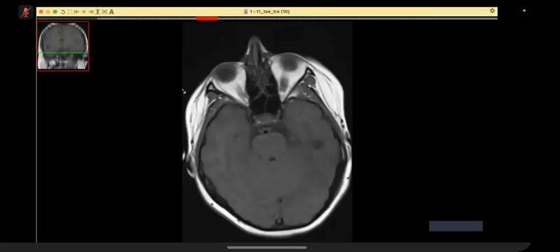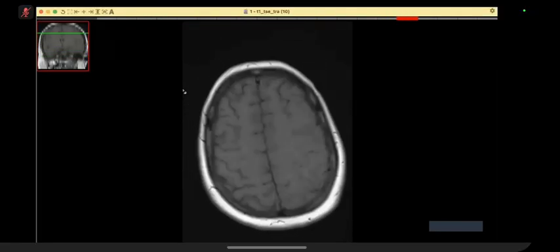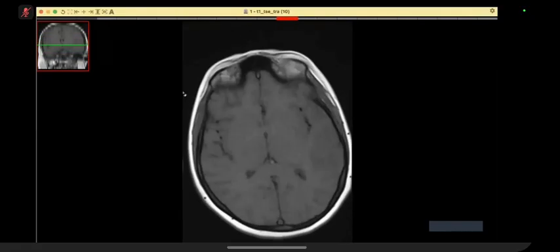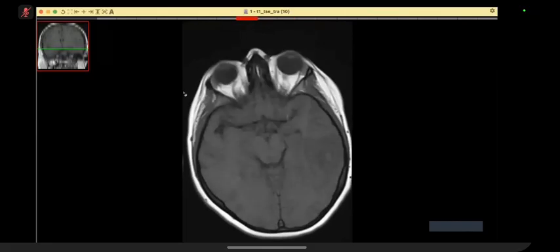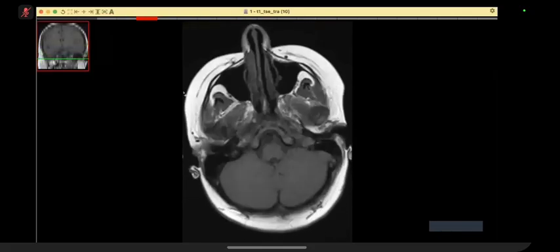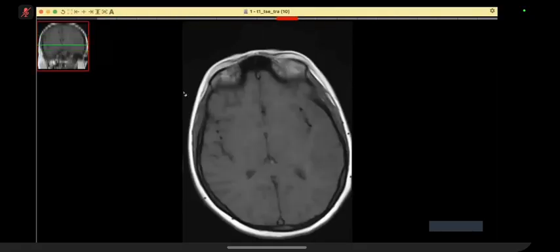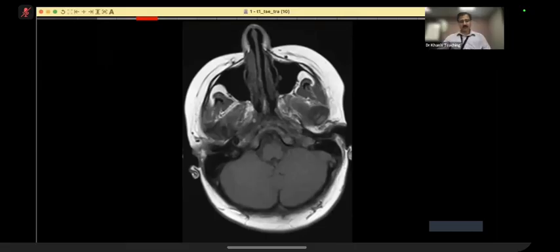Okay, so this could be either a lesion involving the temporal lobe, that could be DNET tumor, that will be my concern. With the history of fever and seizures, I would also keep a differential of herpes simplex virus encephalitis. I would like to correlate with the patient's CSF analysis, clinical history of seizures, and patient needs neurological MDT discussion for further management. Okay, thank you.